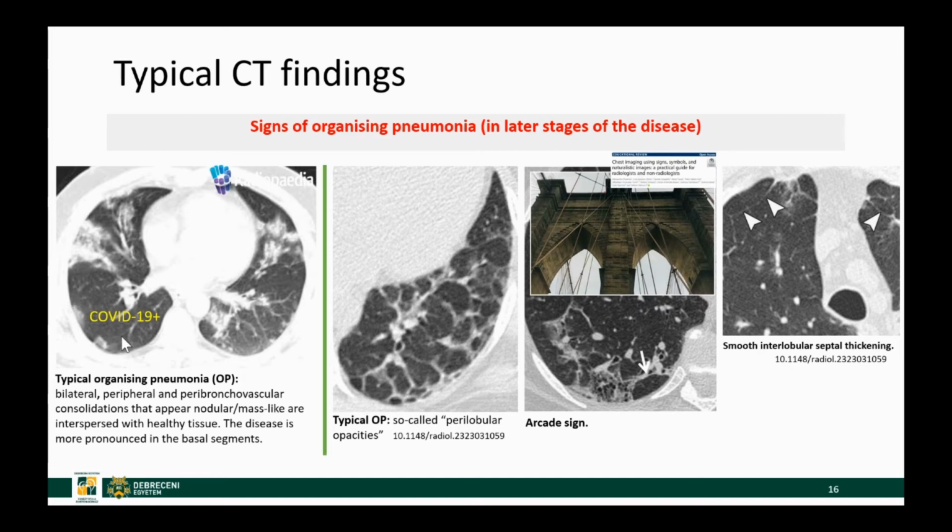And what is not obvious from this one slice is that this morphology is more pronounced in the basal segments, and this was actually a case of COVID-19 pneumonia.